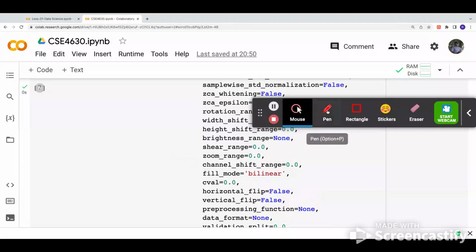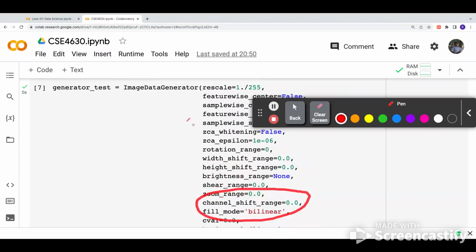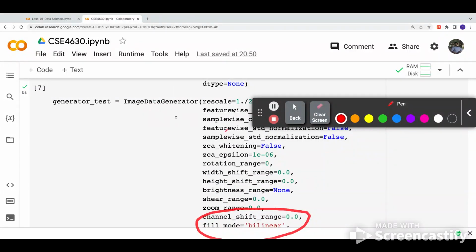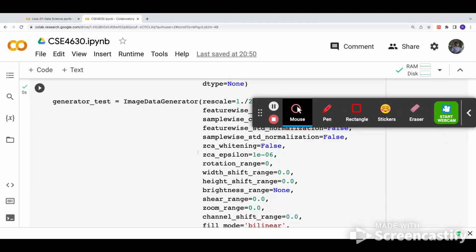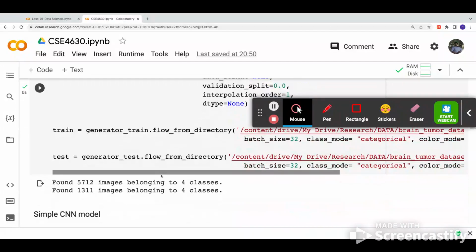Moreover, I have added pre-processing steps here. That's why in my case it produced very good results. So this is a well-generated pre-processing method, and you can use this model directly in your cases. And if you have a small quantity of data, then you can also apply data augmentation.